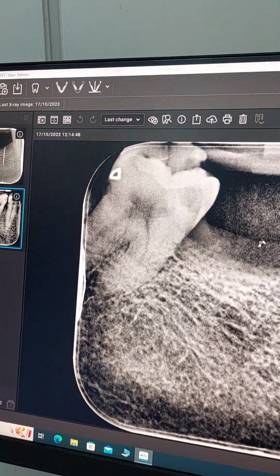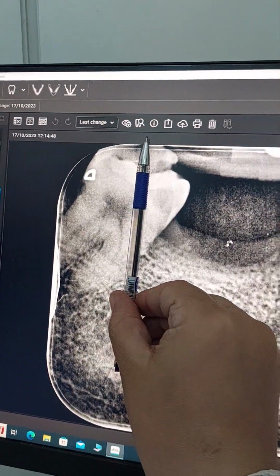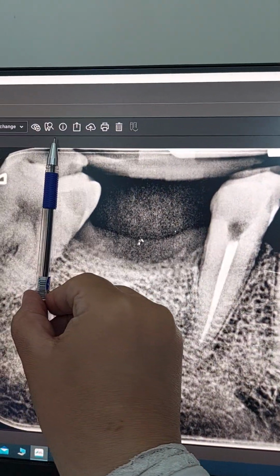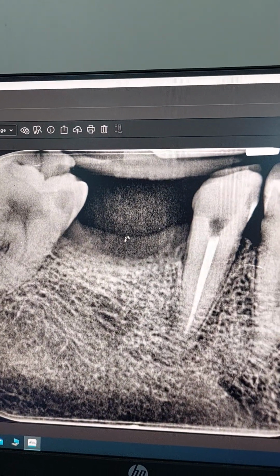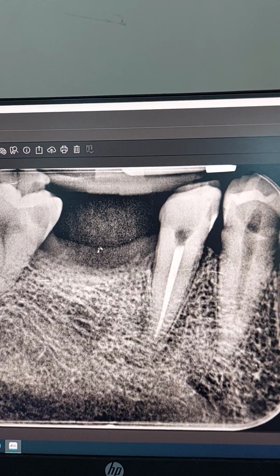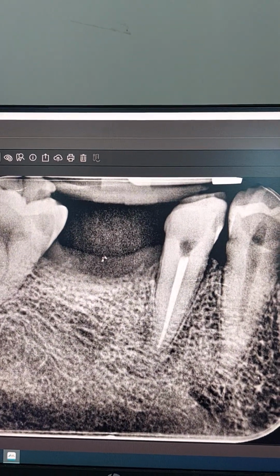Right, we don't have? Okay, so the idea is, once more, look at how much tilt this tooth had, and is this all the space for a 6? No. So this might be an 8 that has been mesially drifted. The amount of drift, it's severely drifted. That means it's a very early extraction. The 7 drifted and the 8 drifted with it.